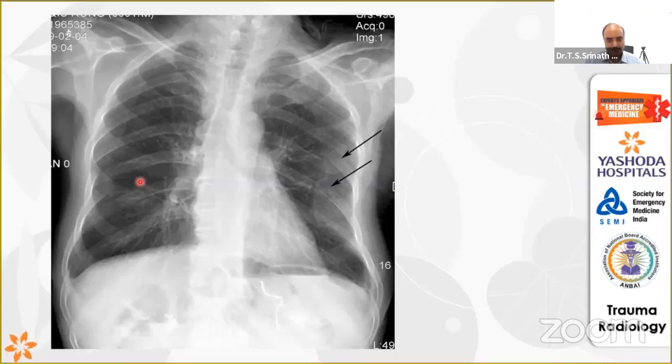They may forget to take the cervicals, the clavicles. Sometimes they may include from here down, and that is an incomplete film. A complete film is one which shows both the clavicles with both the shoulder joints. Okay, so these are the reasons why I'm telling you, you have to keep in your mind.